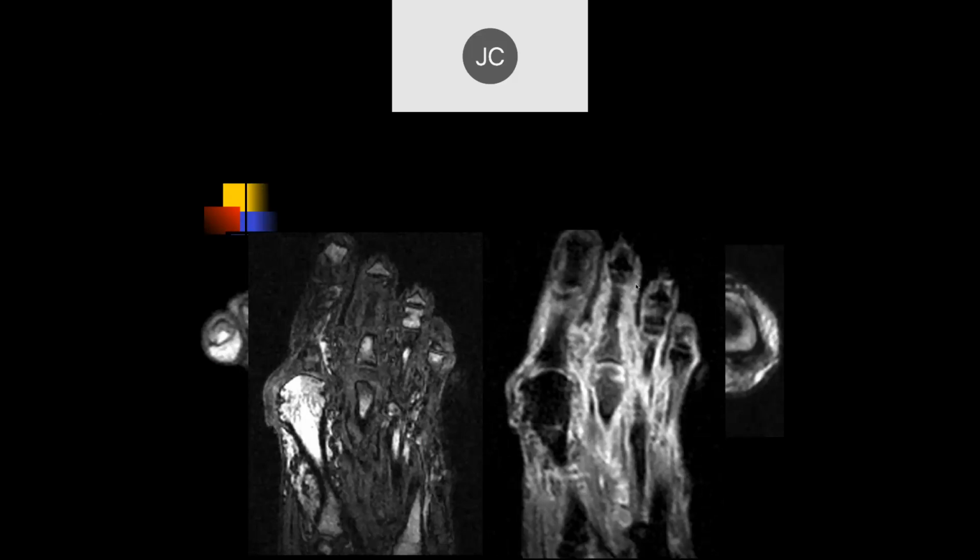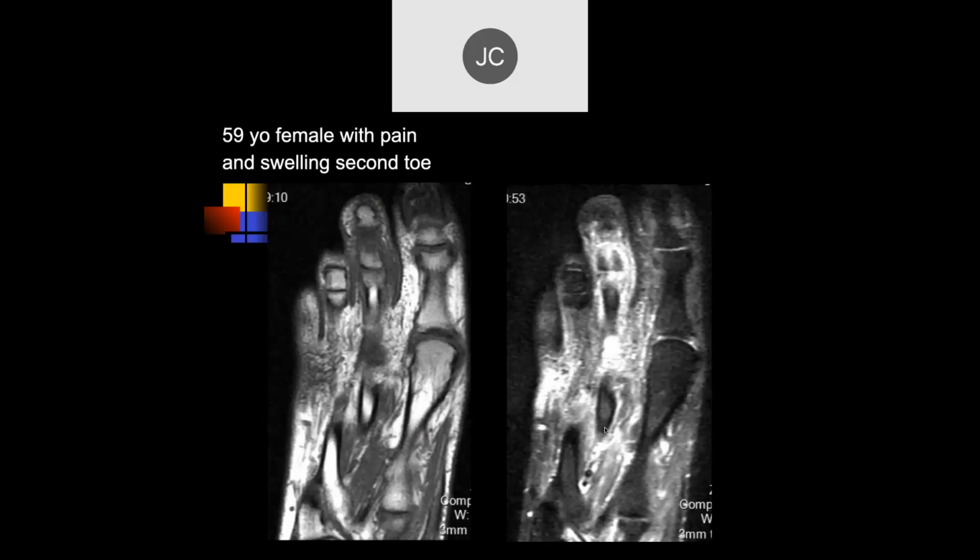Yeah, so circumferential soft tissue thickening, and it's involving one ray. So could this be dactylitis with psoriatic? So this is psoriatic dactylitis. Yeah. Pretty characteristic of psoriatic arthritis. Okay. Right. I would still bet on this being a female. Yeah, it's much more common in females. That's correct. Okay, Robert.